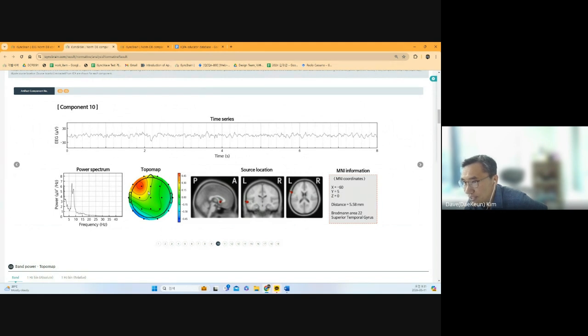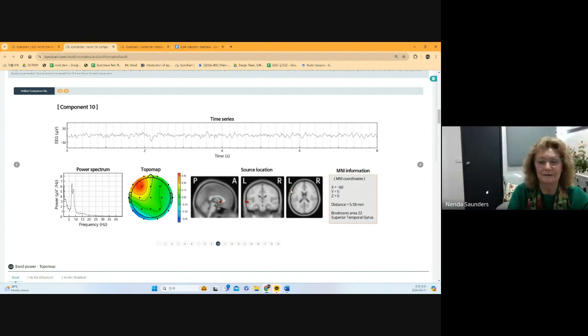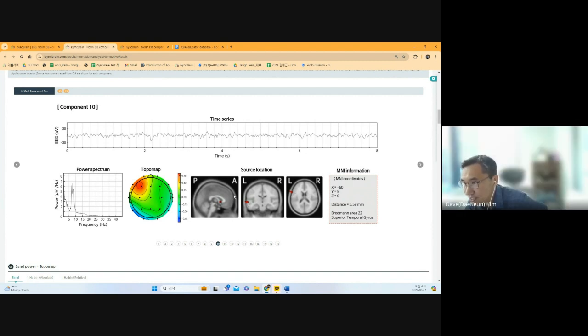So we have the largest amplitude in this frontal area. Coming from y equal 5, just anterior position, but the projection is in the anterior direction, so we have the largest amplitude here. So we have a lot of temporal dipole source, and the projection is frontal or temporal. So we can expect she has a lot of frontal or temporal slow activity.